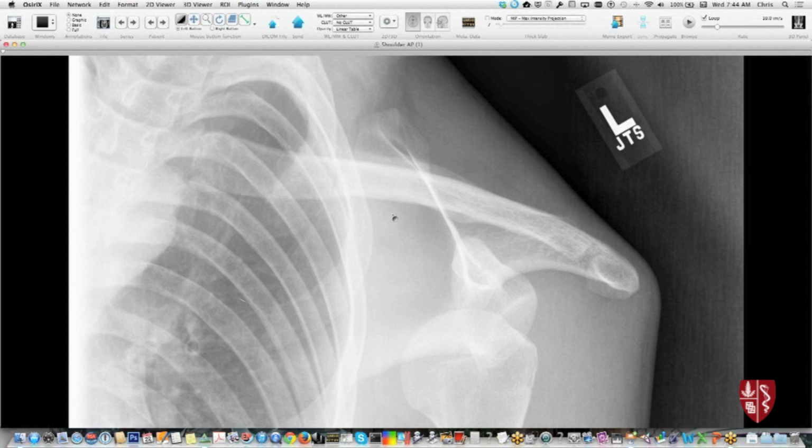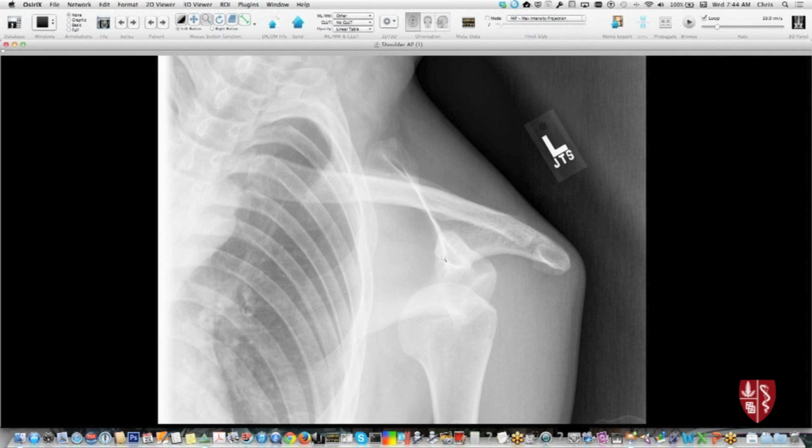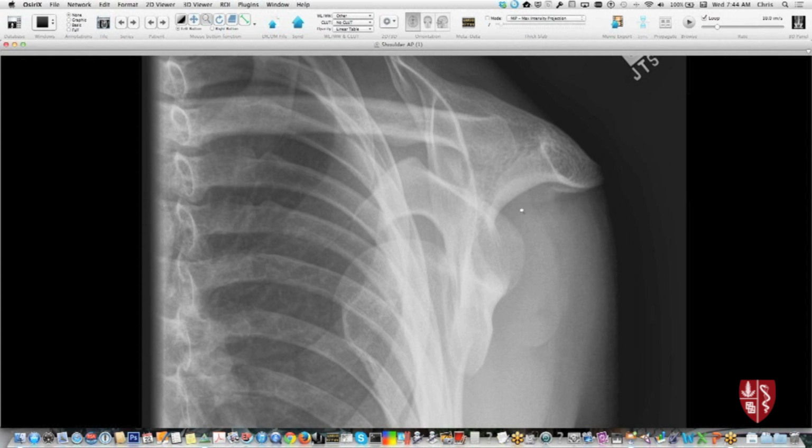Malalignments happen a lot, or dislocations, and so here's an example where it should be pretty obvious to y'all that the glenohumeral alignment is abnormal. The humeral head is displaced inferior relative to the glenoid, and usually in this situation it's anteriorly displaced, so it's antero-inferior dislocation, and you can't really tell whether it really is anterior or posterior on this particular view, but if you have a different view, in this case somewhat of a Y view, you can tell that it's anterior. And again, the key handle on this is that if you can figure out where the Y is, so here's scapular spine, coracoid, scapular body, then the glenoid is here. We know that the coracoid is always anterior, so that if this is humeral head here, it's anterior to the glenoid, so that would be an anterior-inferior dislocation.